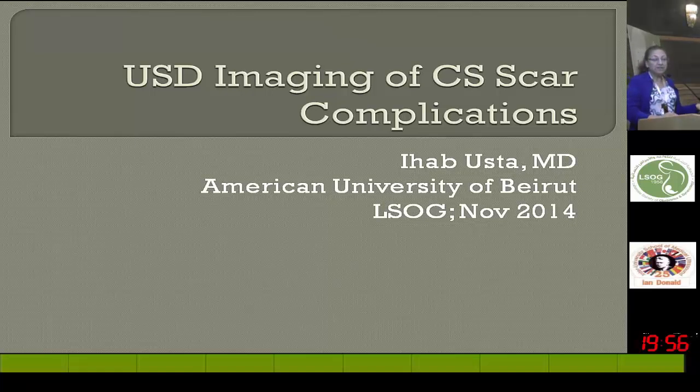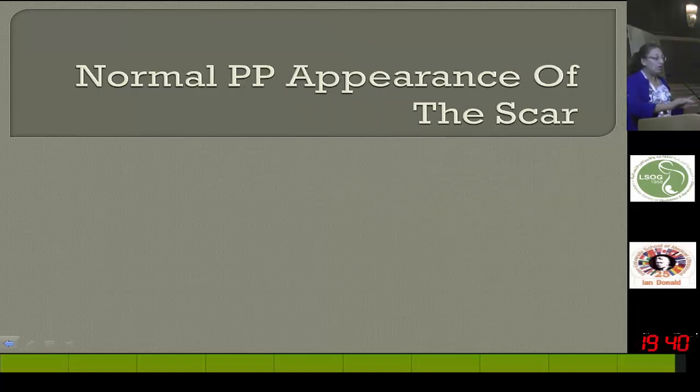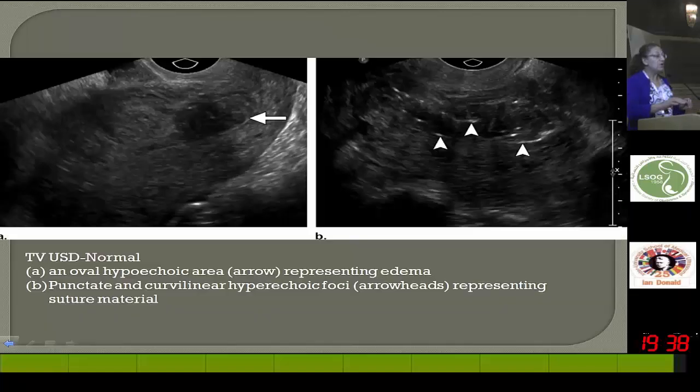Although the title is ultrasound imaging, I will include some CT images because some of the complications of cesarean cannot be visualized very well by ultrasound. So I will start with the topic and show you how the uterus postpartum will look.